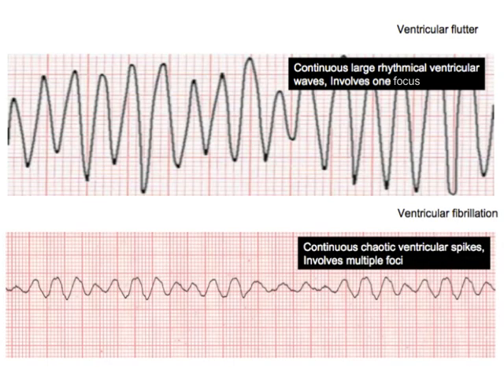Cardiac arrest is indicated here as ventricular fibrillation, or quick sudden cardiac death. The flutter has deteriorated to almost just a buzzing or quiver of the heart tissue. You still have that same undulating, disorganized electrical activity, but there's not even any rhythmic pulsing of the heart in this case. It's just static quiver, almost a tetanic contraction of the heart muscle. There's no pumping of blood. There's just shaking of the heart tissue.